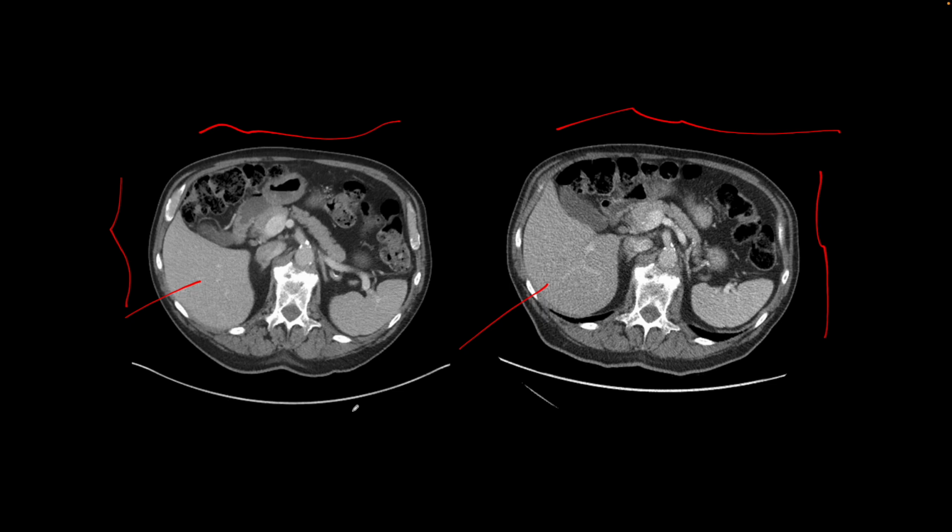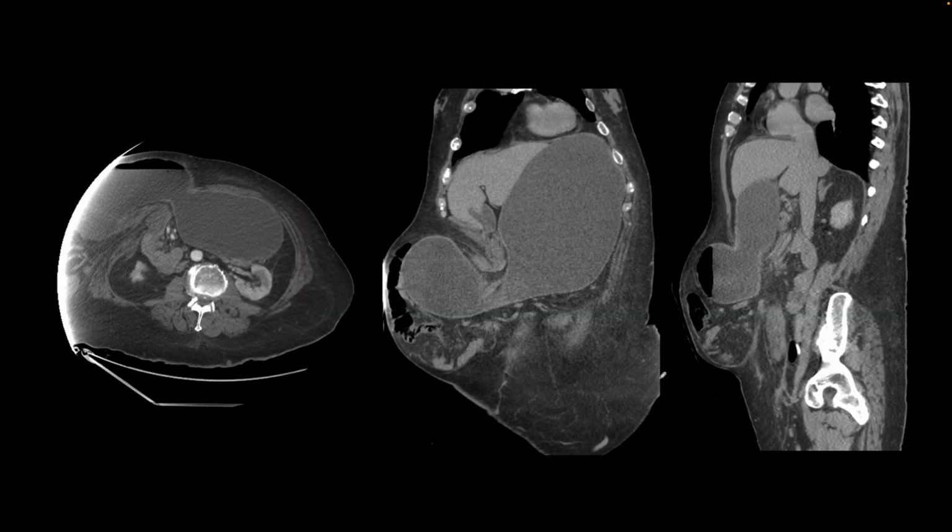It's the tube current. So I went back and I looked at the image annotations, and we found that the image on the left, when it was acquired, the tube current was 305 milliamperes, and the image on the right, when this CT was acquired, they received an X-ray with a current of 137 milliamperes. So current determines the number of X-rays. The more number of X-rays, the better looking is the image, but at the same time there is more radiation exposure to the patient. When you reduce the current, you reduce the number of X-rays, and the images start to appear pixely. That's like the basic of CT imaging.